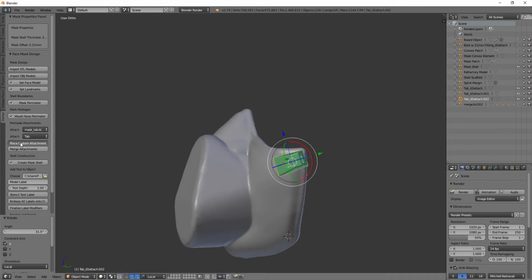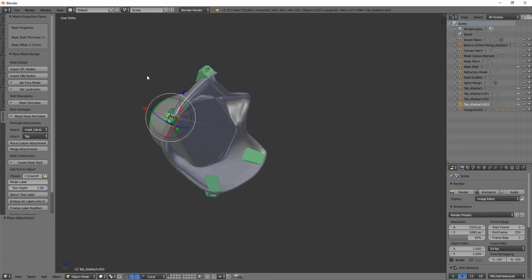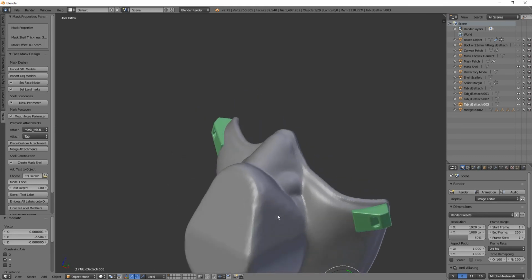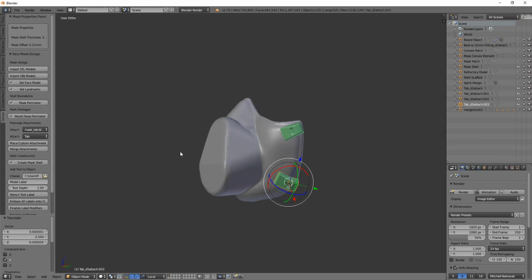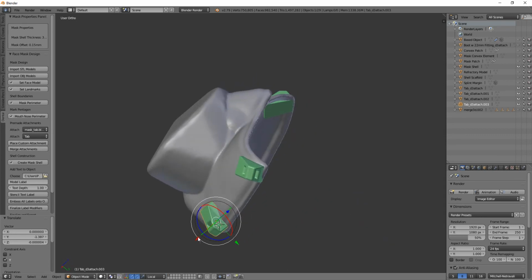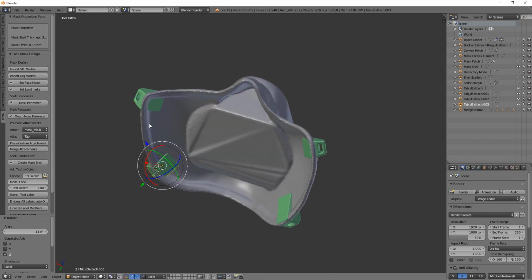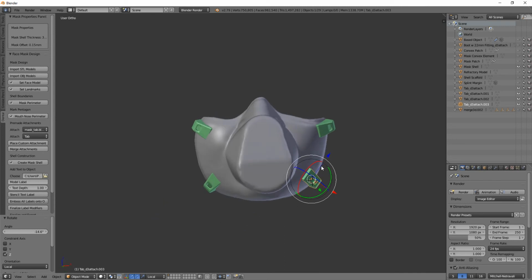Also, the attachments are pretty good at figuring out what direction they're supposed to be in. And also, if you drag your mask border a little further posterior, you have a nice flat spot to add these attachments. Sink it in a little deeper. Too deep. Okay, great. So now we have our attachments.